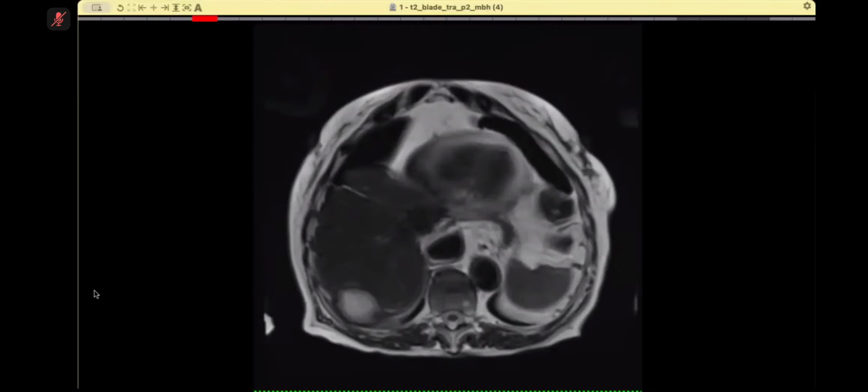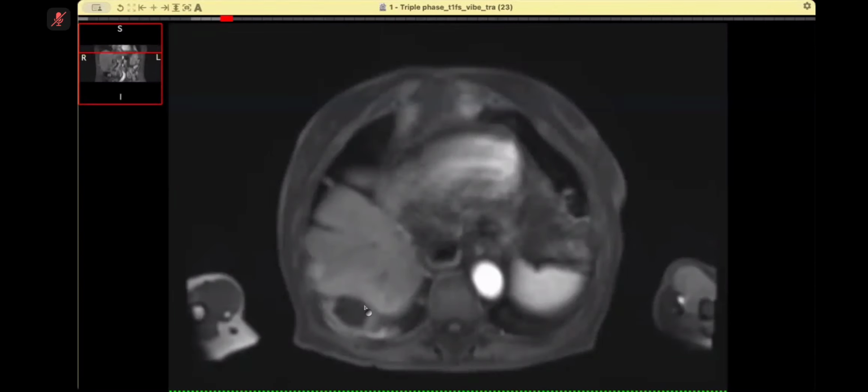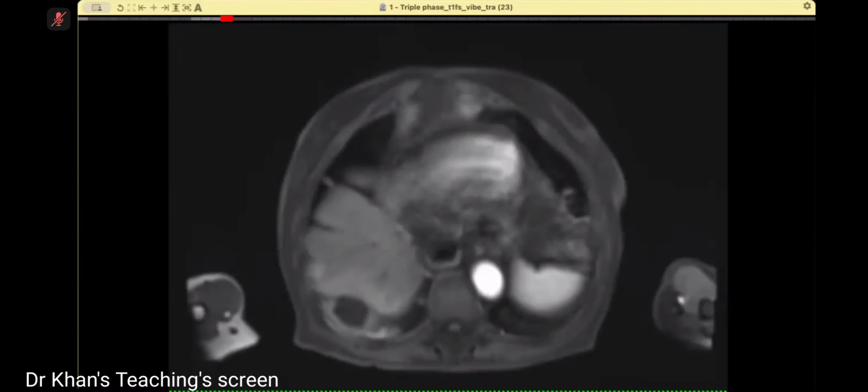An MR was also done, and on MR, of course, there was an abscess here, and I just want to show you a post contrast. You can see enhancement, and on a DWI sequence, which is this one, you can see how bright the pus is. So this was an abscess. Okay, good, well done. Story case.